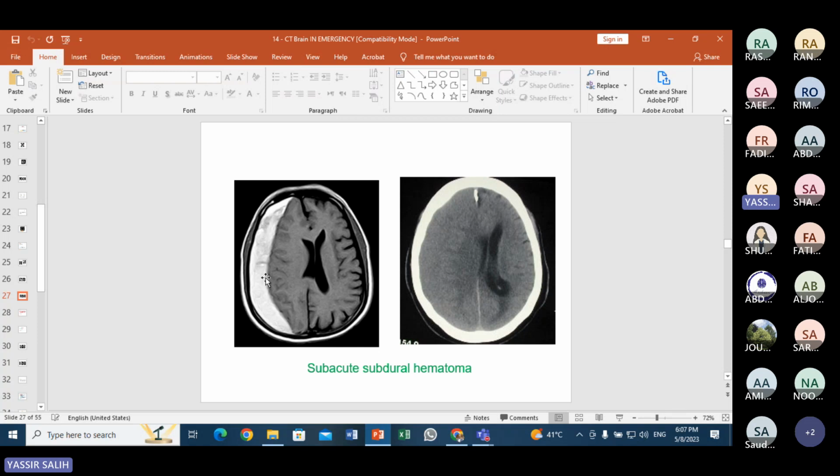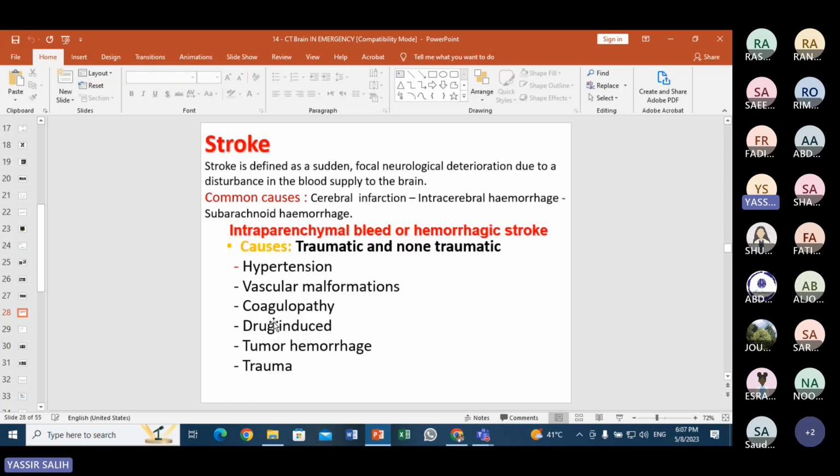أهم شيء الشيب بتاعه كان في CT or MRI بيكون concave inner margin eccentric shape. In MRI بنسميه hyperintense. On T1 it appears hyperintense or of high signal. إذا عملنا T2 also حتكون نفس الشيب ونفس الانتنسيتي لأنه السباكيوت blood appears hyperintense in both T1 and T2.